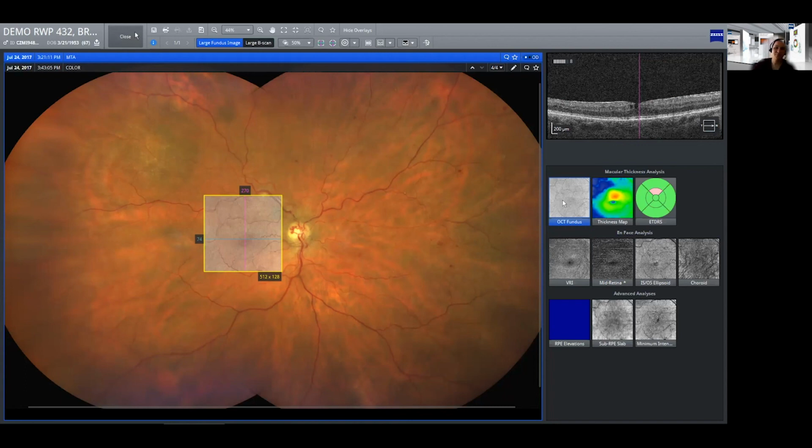And you can always adjust your way accordingly. Now, one question that we do get a lot is, well, this is really cool, but does this also work with OCT devices that are not from ZEISS? Unfortunately, it does not in this capacity. All these analyses that are done here are based on a lot of proprietary analysis algorithms and normative databases that ZEISS owns, and we only have access to that information.